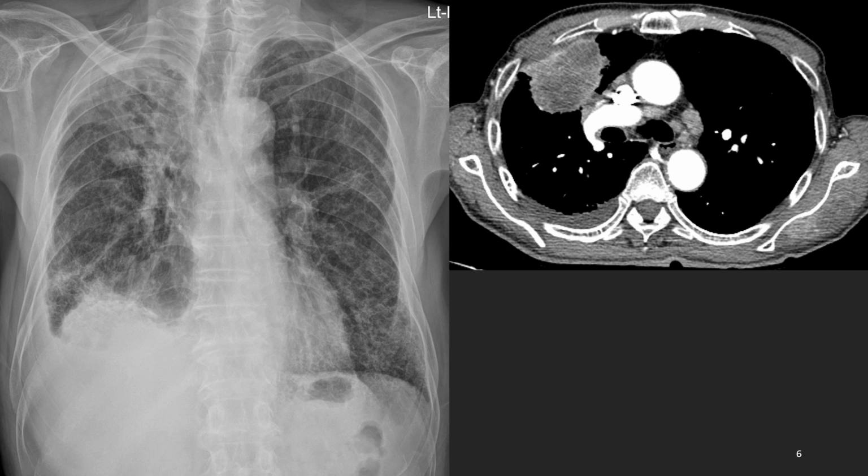Let's see the first case. What do we see? His lung is not looking good. Emphysema here, interstitial lung disease here. The right upper lobe shows many masses or nodules and pleural thickening, paratracheal bulging, increased opacity, right pleural effusion, and non-visualization of the right diaphragm, which may be phrenic nerve palsy. This is right upper lobe lung cancer with pleural metastasis and many lymph node metastases.